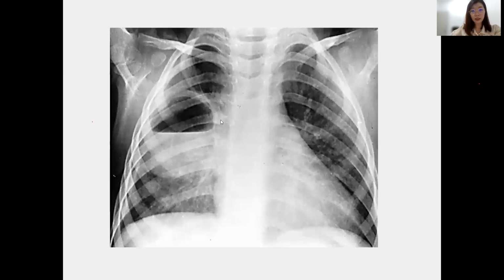So anyone can answer this X-ray, the easy one? Okay.